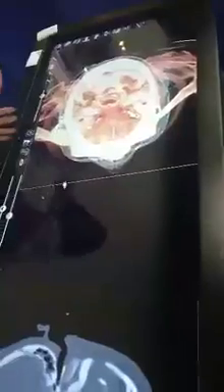And you can also add in some vasculature if needed. And you can also bring it back down. There's other ways where you can utilize this where I bring in transparent soft and hard tissue. And so in this case, you still see where the clips were placed.